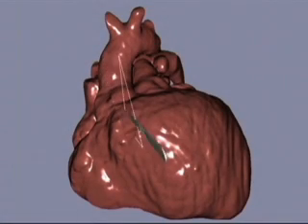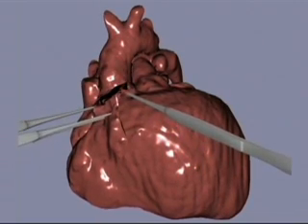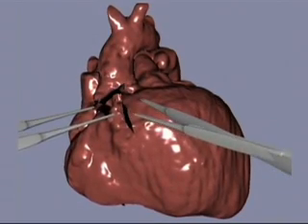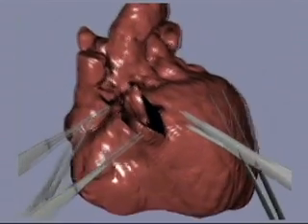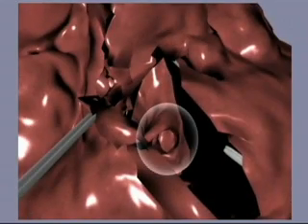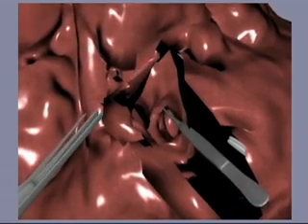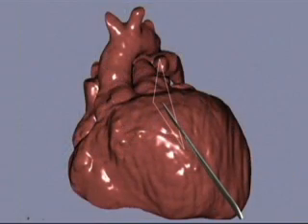An incision is made at the aortic root. When the tissue is pulled aside and fixed using the available instruments, a view of the interior tunnel is revealed. The tunnel passageway is quite narrow. The surgeon pulls the tissue aside to see if any of the two defects are revealed. As none of the defects can be located, an incision point at the aortic root is discarded.